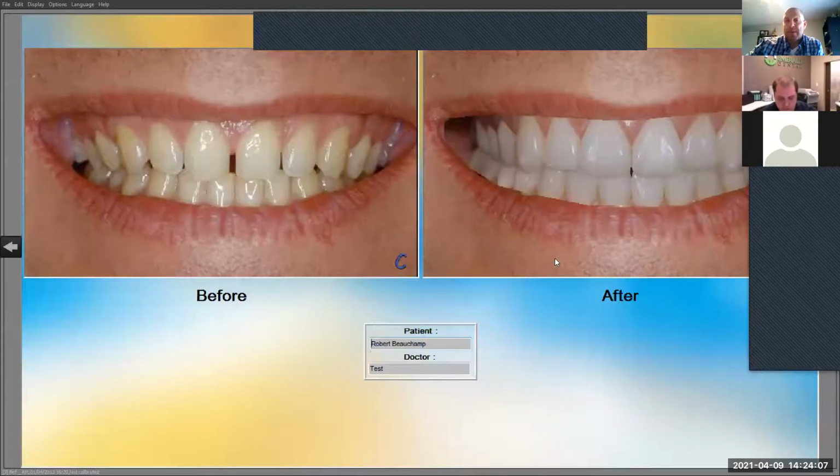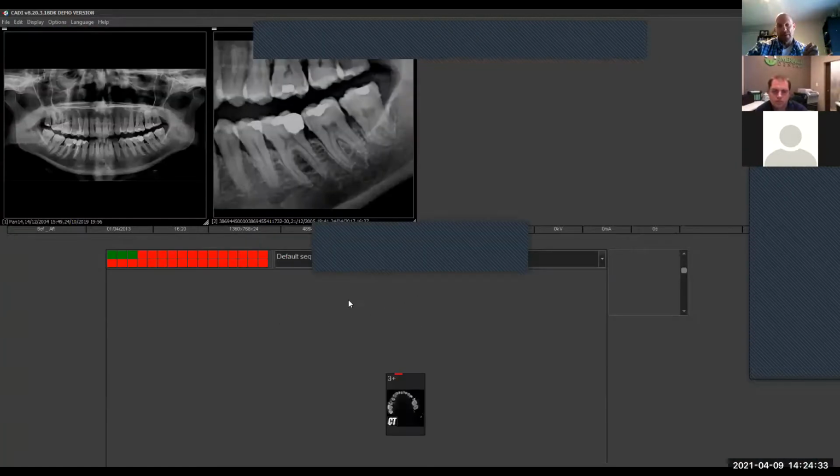Here's an image of one that I did. The lighting is a little bit off here, but it's an example of a smile that I slapped into this one when I had it. The Hornbrook library was designed with a whole bunch of different smiles, and it gives you different shapes and these types of things. But you can import your own images into the Smile library. So the Smile library comes with stock images, right? Some or none. I don't think it has any unless you buy the Smile library element, which we didn't.